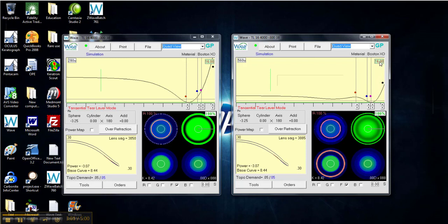There's 3376, but my edge angle is probably a little bit too steep, so I'm going to raise that a little bit more. Go a little further. But I need to bring this back down. There's 3376, just like on this design, and the edge is 38, 34. Over here we are at 38.4, 34, so I can raise this a little bit further.